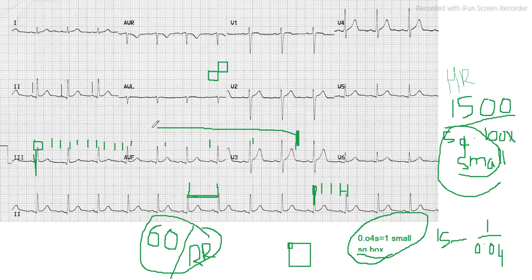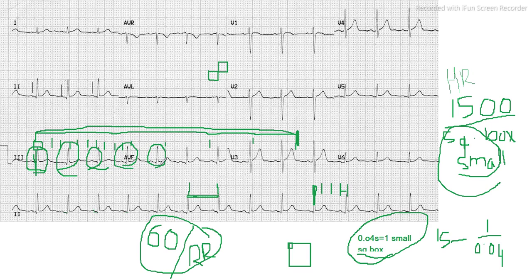So from here to here, this is a 6 second time interval. This means a 30 square box interval is here. So you count how many QRS complexes are there. So you see here it is 1, 2, 3, 4, 5, 6, 7, 8. Oh, oops, sorry.